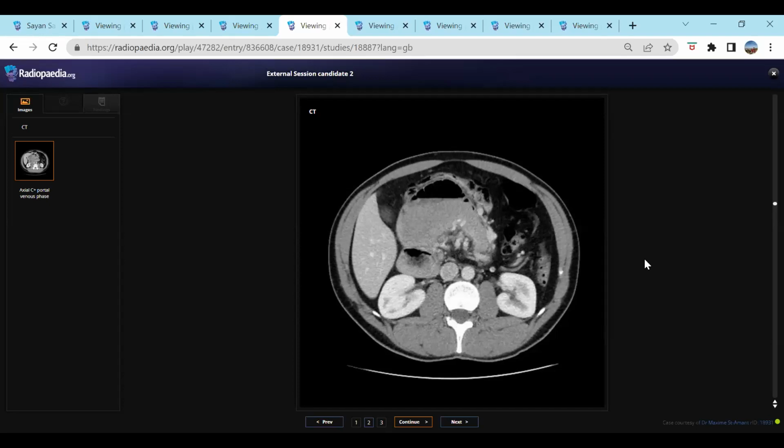Okay. What is the reason behind that? Because this could be because of a lax mesentery, which has caused... No, I mean, not the anatomical reasoning. I'm just saying, what is the closed loop obstruction due to in this particular case? Volvulus. Yes. Okay. Carry on.